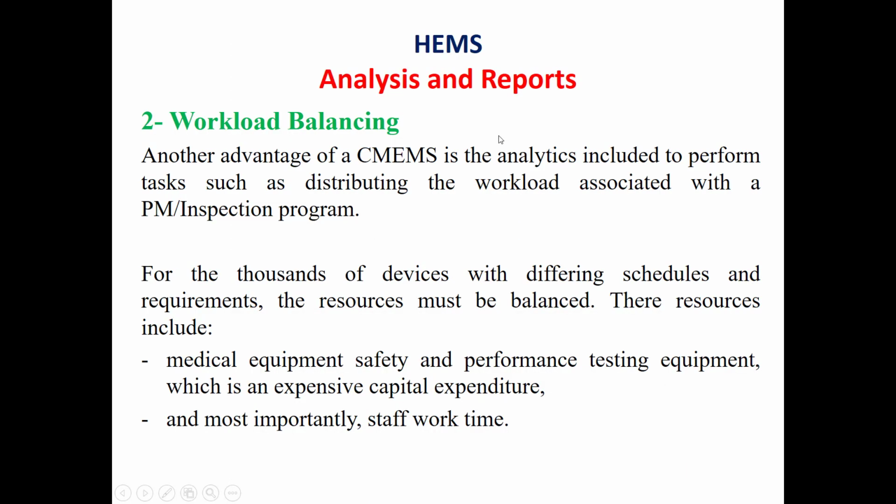The second type of report generated by the computerized medical equipment management system is workload balancing. Another advantage of the CMEMS is the analytics included to perform tasks such as distributing the workload associated with the PM inspection program.